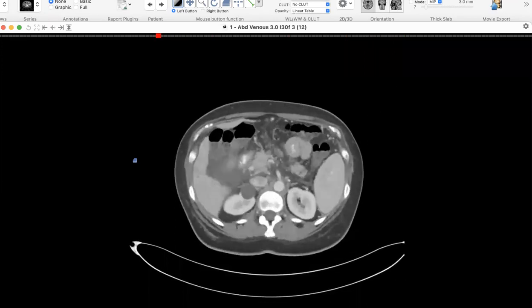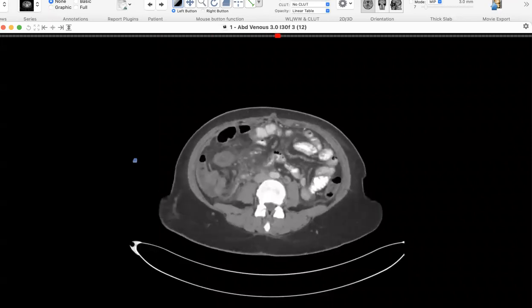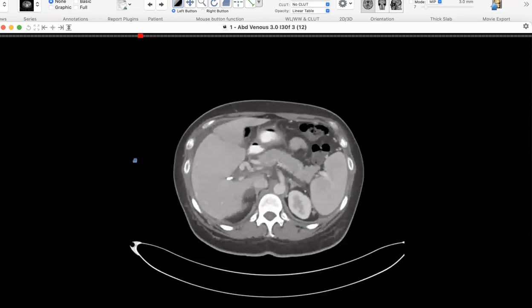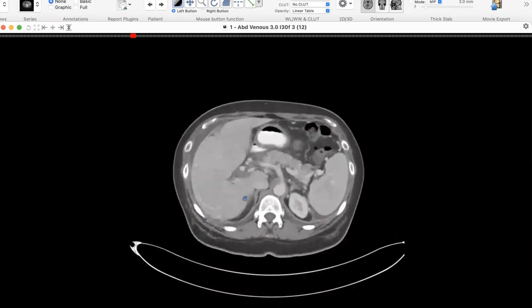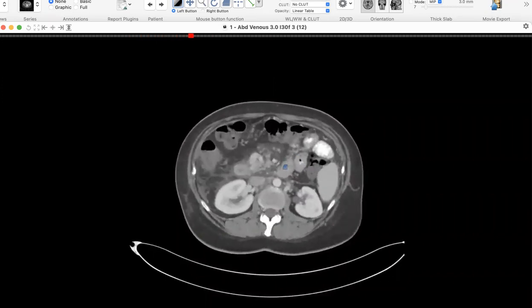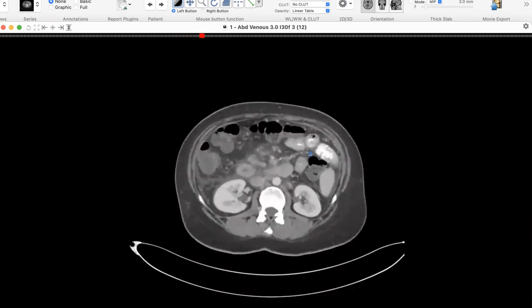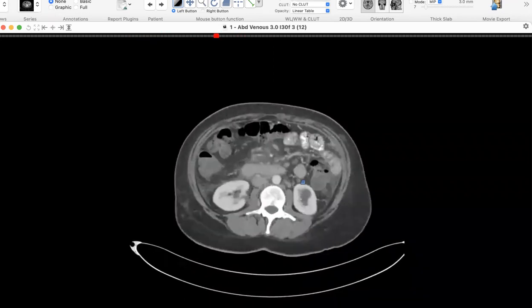Other small bowel appears involved also. There is a regional area, the duodenojejunal area, involved with this thickening also. Can you show me? Yeah, here. Going to the duodenum and proximal, this one. You would say this is similar to the thickening of the ileum that you saw?